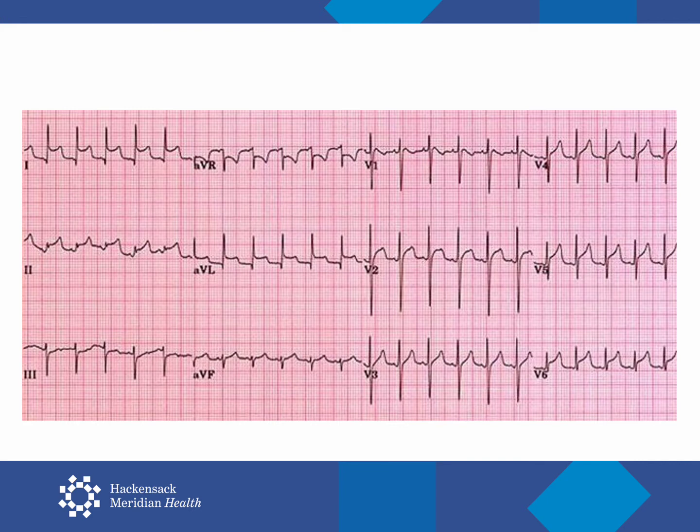Another possibility for a diffuse injury, in other words, an injury which cannot be attributed to one specific artery or another, is pericarditis. One extra clue that this might be pericarditis is that the PR interval is slightly depressed in lead 2. Now, if this were a 65-year-old diabetic man with crushing chest pain, I might not hang my hat on it. Well, that is to say, I might not hang his hat on it, but this tracing is very strongly suggestive of acute pericarditis.